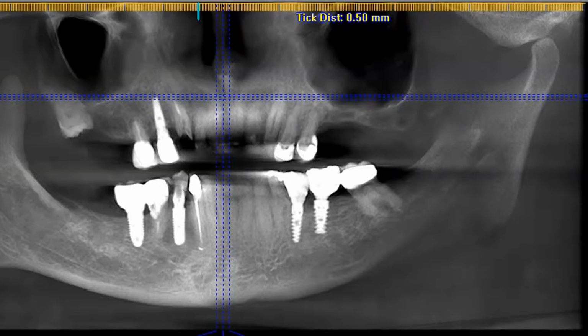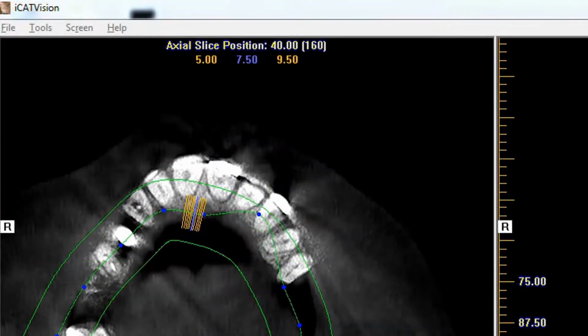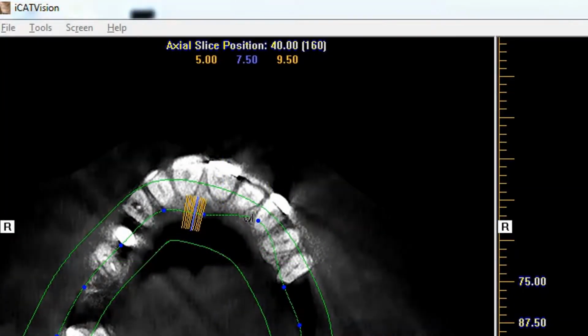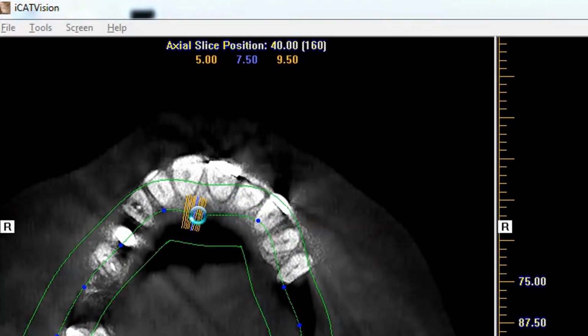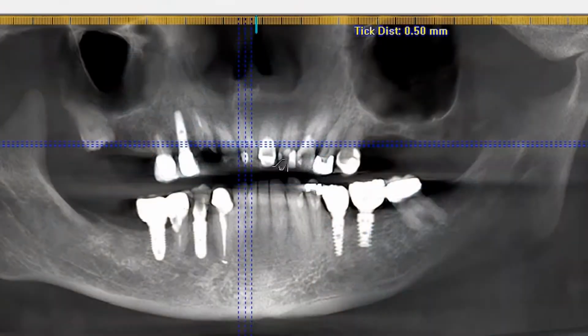Because I made it so that it is now in this viewer slice here. And if we want to do a little better towards the front, maybe we bring those dots a little more forward. Now you'll see our slice view getting better as I go forward here and make the appropriate adjustment.